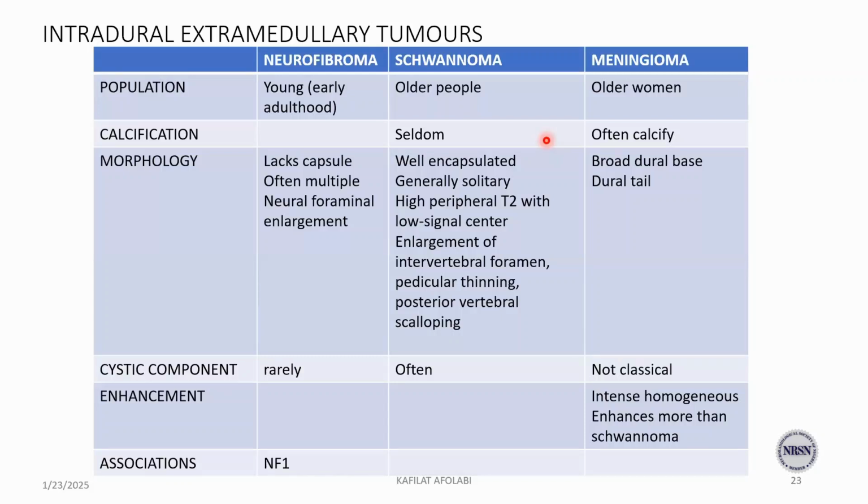It's often calcified. So if you see calcification, most likely meningioma. Meningioma classically shows a dural tail, so it's just like in the brain. So that's more in keeping. The three lesions are enhancing. Again, repetition aids memory. If there's a cystic area within the lesion, likely to be schwannoma.